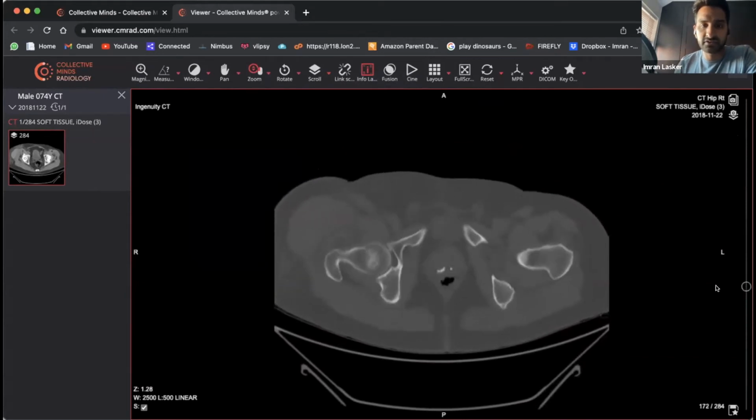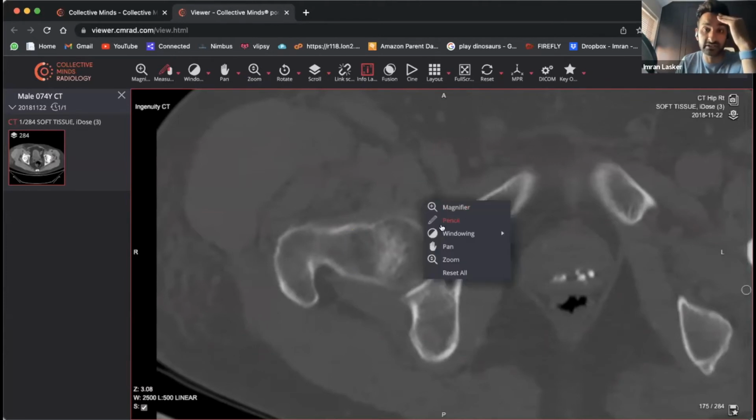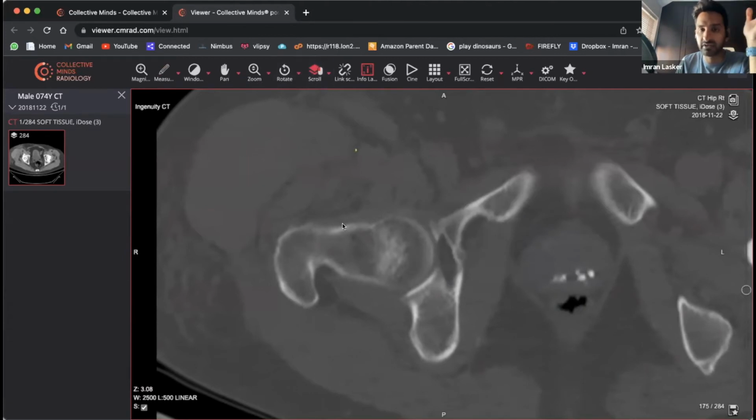So you scroll through, and especially with the neck, you've got to be really careful when you zoom in, because obviously there are fractures that are obvious, right? Like you're looking at a proper discrepancy, but sometimes what you get is a slightly increased sclerotic line going like this, and that's a really subtle impaction fracture. And I missed one once actually. And then we had to do an MRI scan, and the MRI scan showed florid edema within that region. You go back to the CT, there it was. It was a subtle fracture.